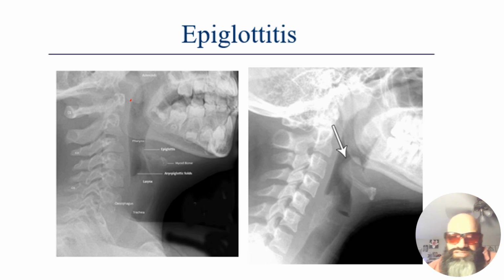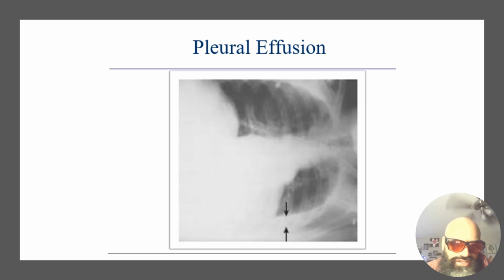So same thing here as we just discussed in class. You're going to see turbulence with your airway because it's now compromised. It's thinner. You have this bottlenose effect occurring here. It will cause an increased amount of salivation to occur and drooling. But this particular finding here is consistent with epiglottitis, which, if not treated urgently, can eventually swell up to the point where it completely blocks that airway from doing its function.